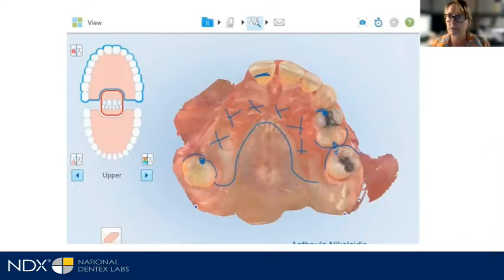The image, when you save it, goes directly to your myitero.com account. So you log on to myitero.com, your image is there, and then you would email that to your laboratory. At this moment, it does not tag along with the scans from the case. I anticipate that to change within the iTero software sooner than later, but I don't have a definitive date as to when that will be occurring. Great question.